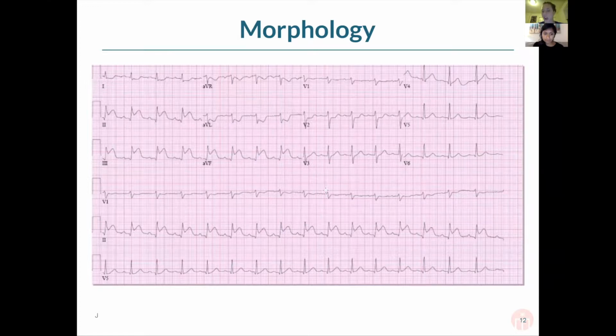And so this is the classic type of picture where if they ask you what type of medicine not to give a patient, nitrates or nitro, it is not something that you would want to give. Nitroglycerin, sorry for using the term. Nitroglycerin is not what you want to give this patient for their chest pain. And so that may be something that's pertinent.